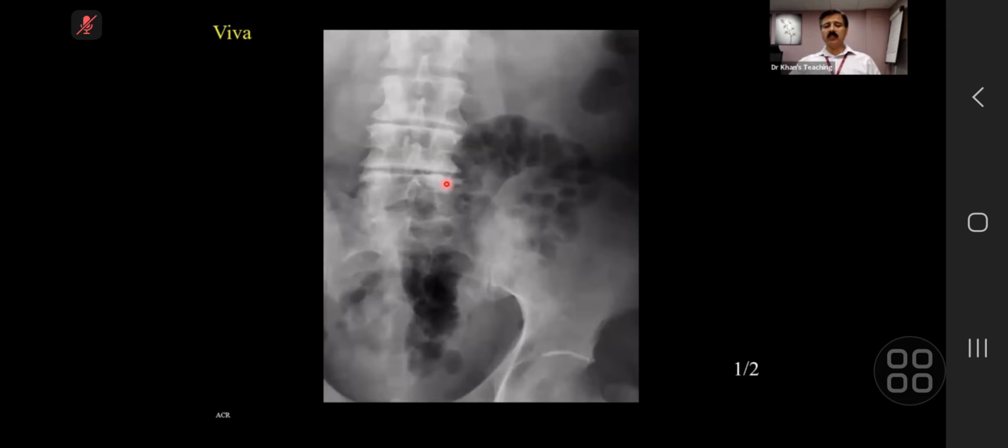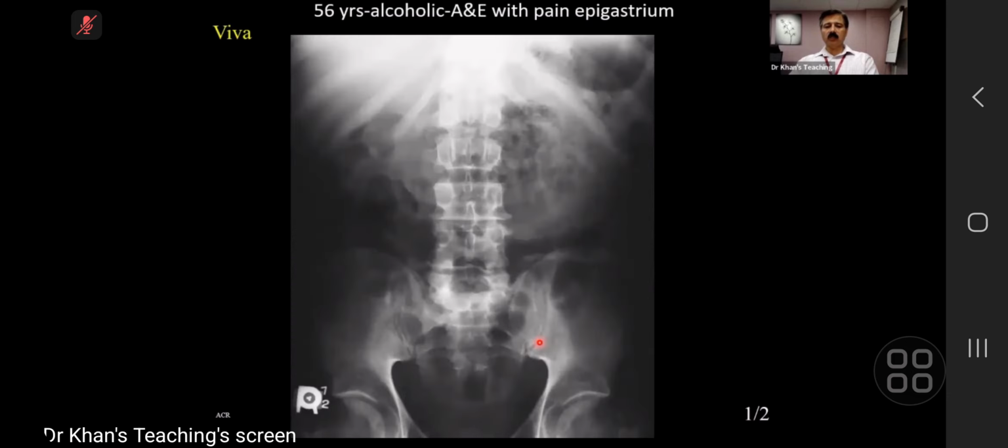And when these air bubbles burst, the patient might develop pneumoperitoneum without any peritonitis. So we use that phrase, pneumoperitoneum without peritonitis. The patient will be absolutely fine. So this is idiopathic pneumatosis intestinalis. Classical 2B film. I've been very kind as an examiner to give you this history, but because of time factor, I have given you this history. But this is a classical, very good 2B film. Over to you.